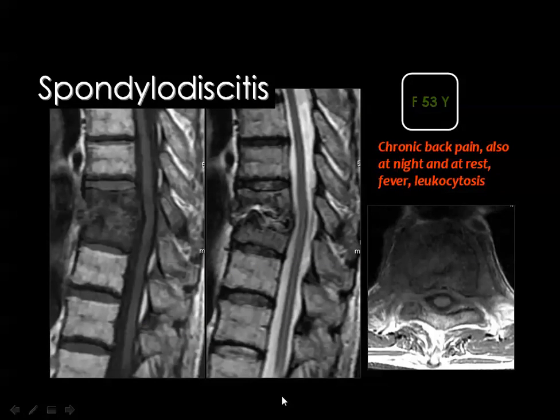This is also a spondylodiscitis, or inflammation of the spine and the disc. The two vertebral bodies as well as the intervening disc are inflamed. The disc showed bright signal in the T2 weighted image, denoting the increased water content due to infection, and the bone marrow edema affects the vertebral body above and below the disc. There is some intraspinal extension of the inflammatory granulation tissue, which is not compressing the cord.